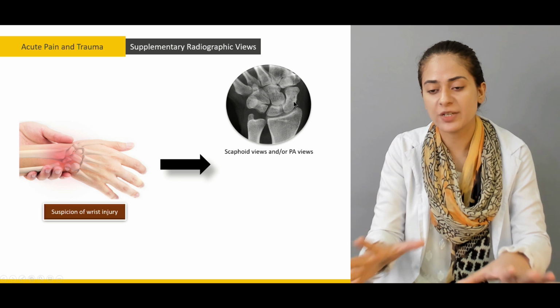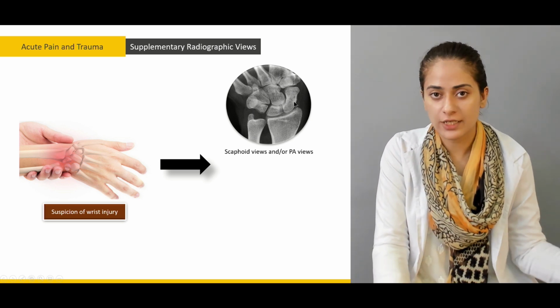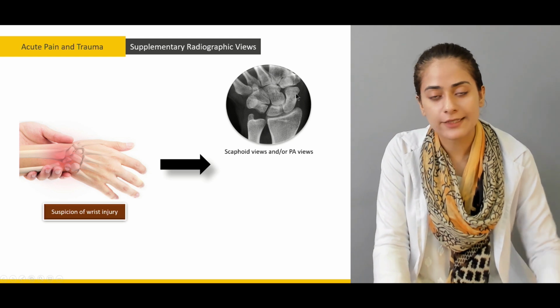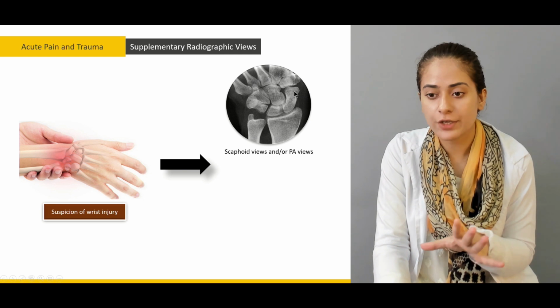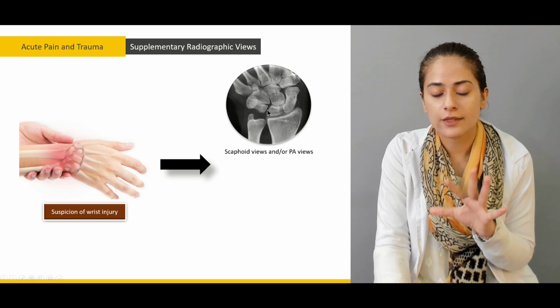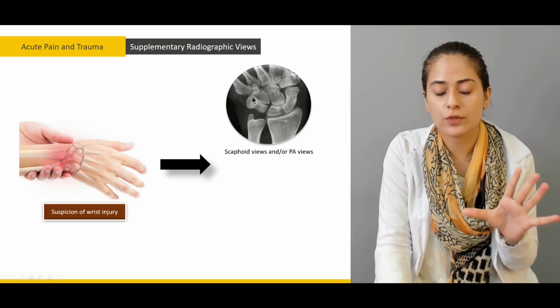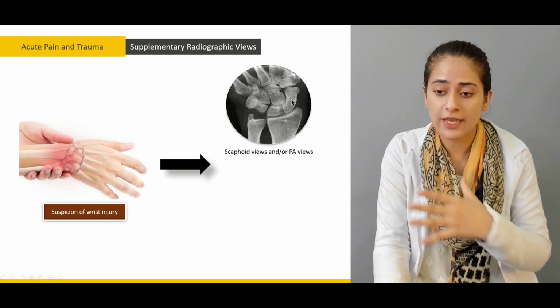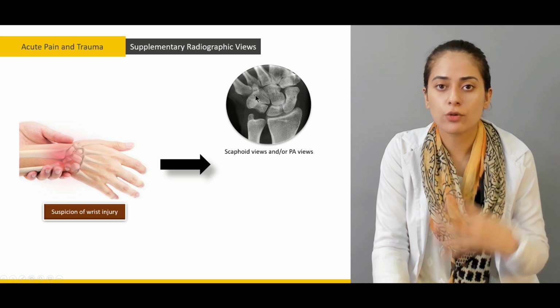And again, I will repeat the mnemonic here. So this is: she looks too pretty, try to catch her. So S is for scaphoid. So this is scaphoid. Looks L, so lunate. And then we have too pretty, so that is triquetrum, and then we have pisiform. So that is the lower row of carpal bones. So these are 4, and the upper row again 4.